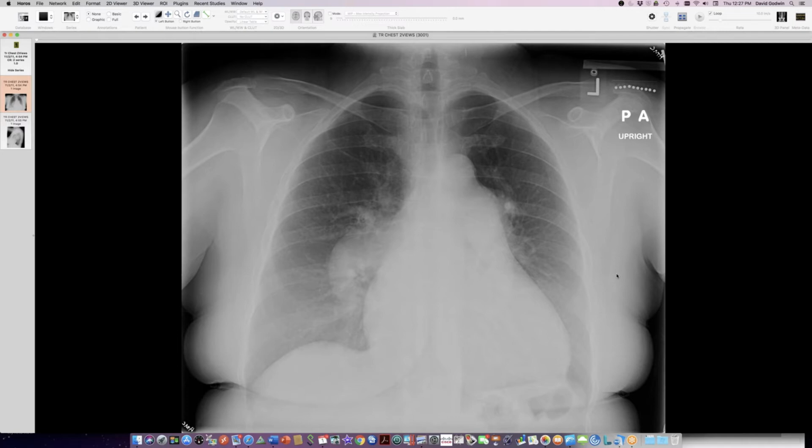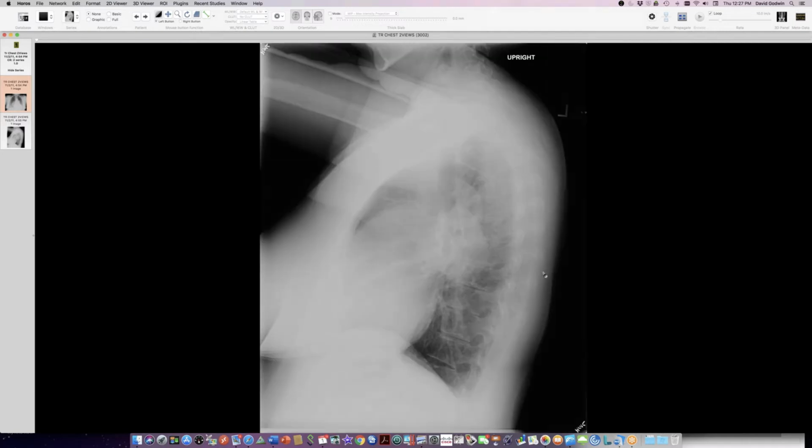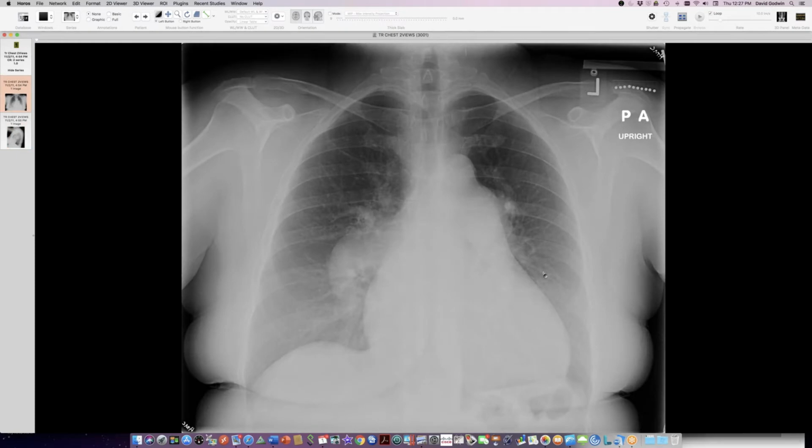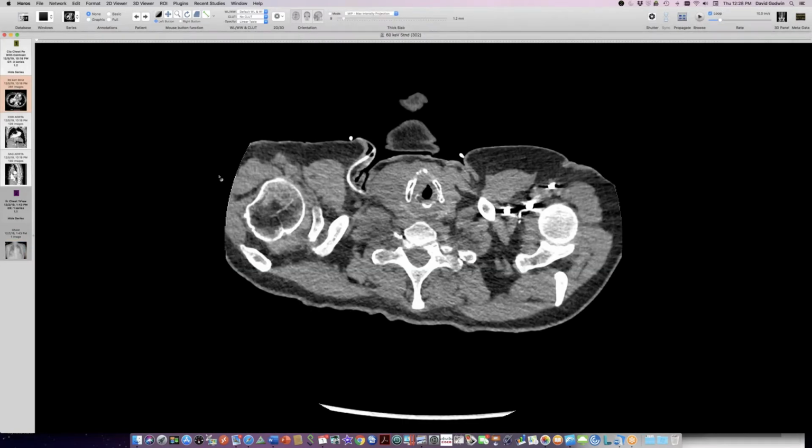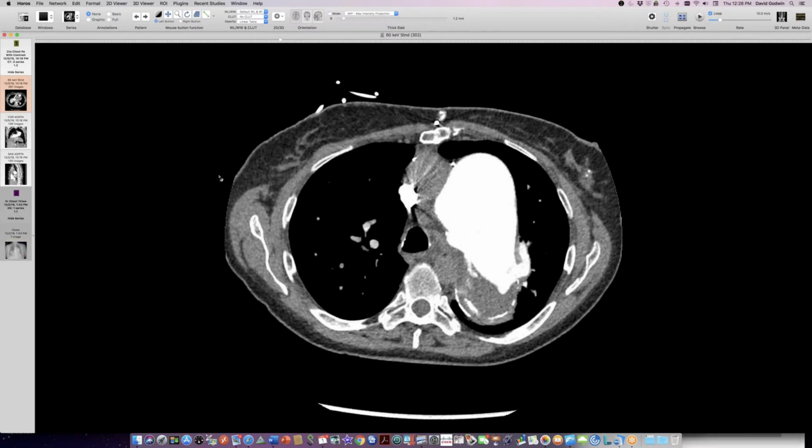How's that sound? So this woman had this set of radiographs back in 2011 showing pulmonary hypertension. She had CTEPH. She got a thromboendarterectomy. A while later, this is current imaging, things have not gone well. Her pulmonary arteries are more enlarged. She has calcification in the walls of the artery, reflecting the atherosclerosis from long-time pulmonary hypertension. And CT was also abnormal, as you might expect.